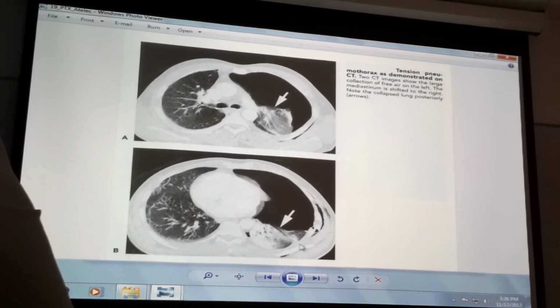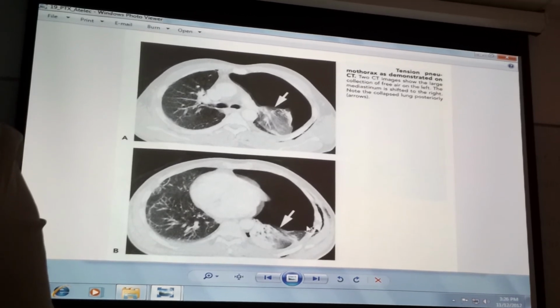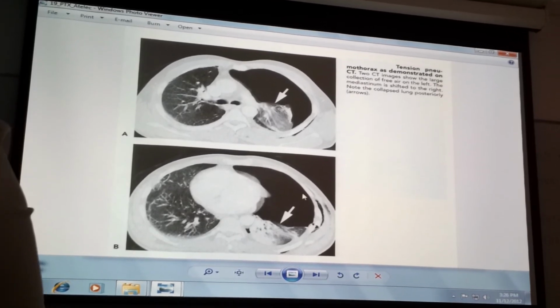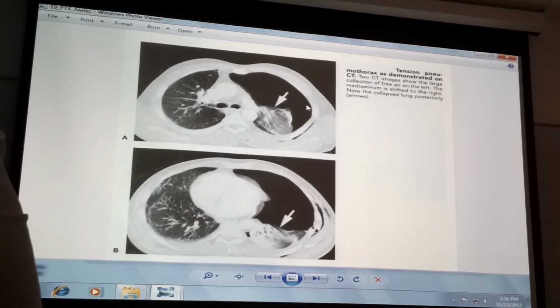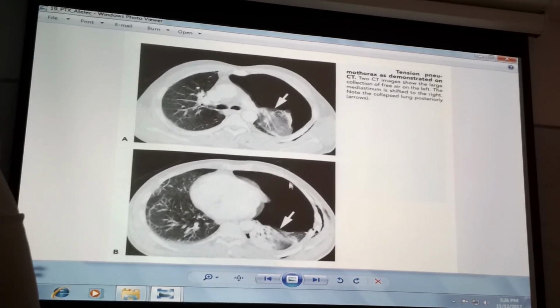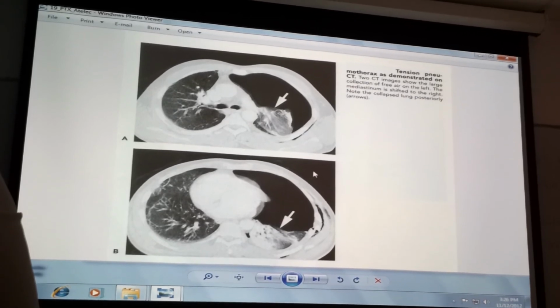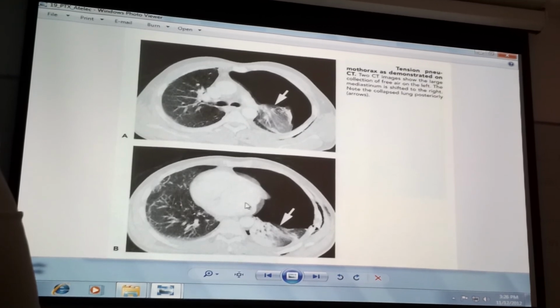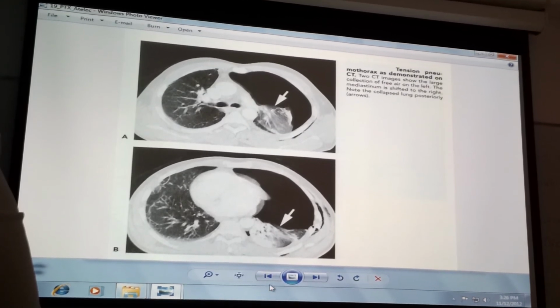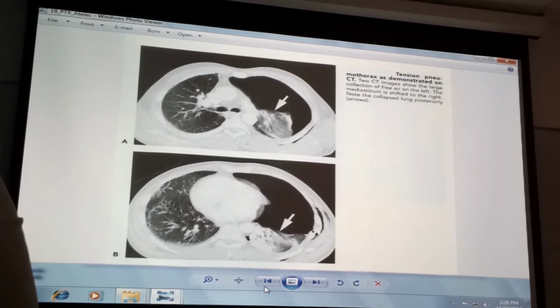The main thing is that maybe this patient fell out of bed, or was walking into the shower and hit against it, and ended up with a rib fracture. And because a rib is like a knife when it cracks, it created a pneumothorax. Do you see the difference? Do you see the difference, it's completely black just like out here? You know that's a pneumothorax. And there's a shift of the mediastinal structures to the opposite side. Any questions on that? Okay, very clear, right? Crystal clear.